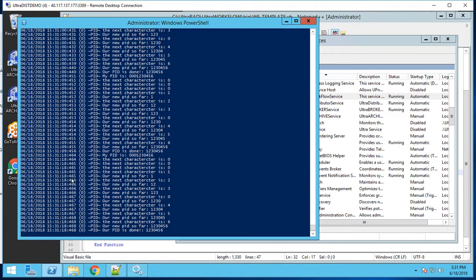And you can see the script runs pretty quick, right? It kind of flies through there. You just see that whole block of text. It's not like you see it going through the steps because it happens almost immediately.